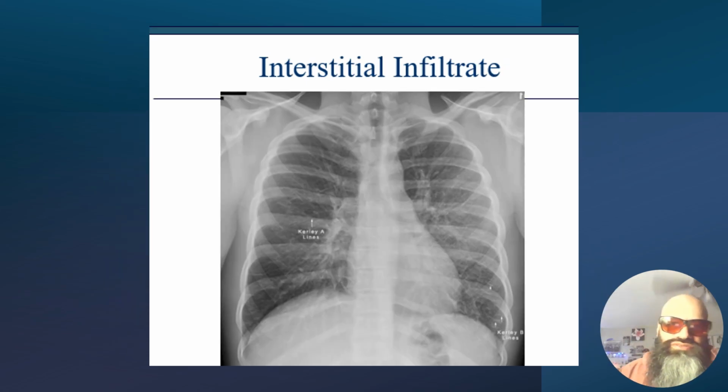So, interstitial infiltrate. Basically the interstitium is the scaffolding of the lung. Basically a lattice-like network that holds all the structures up. There's different areas of division called septa within the lobes that also help to classify and differentiate the vessels and lymphatics, as well as the arterioles and bronchi. Now notice that all of these structures have very thin walls, so when fluid resides in them, they're clearly visible on a pathologic chest X-ray.